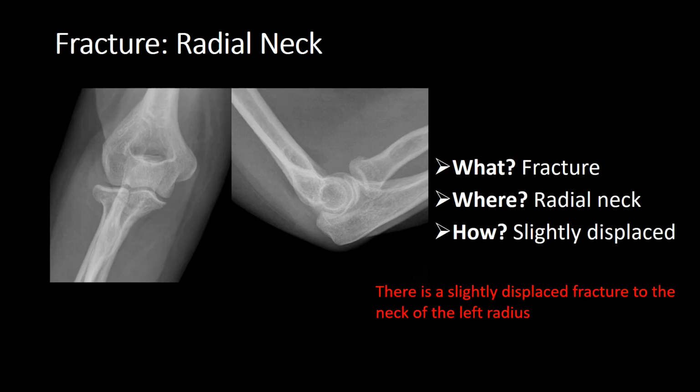So what is it? It's a fracture. Where? The radial neck. How? Slight displacement.